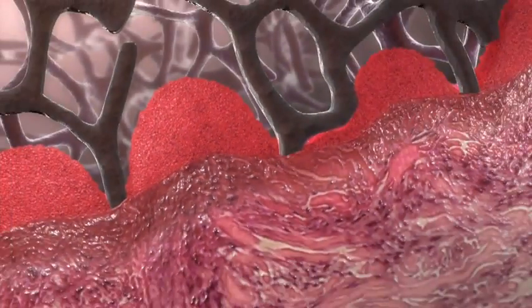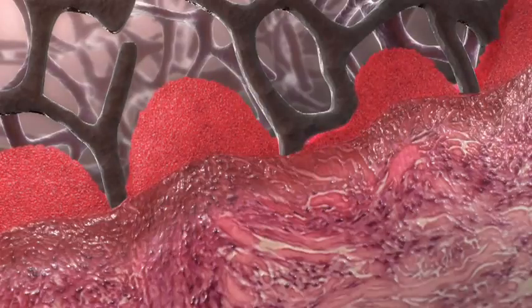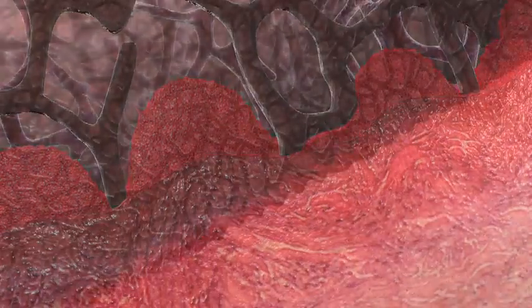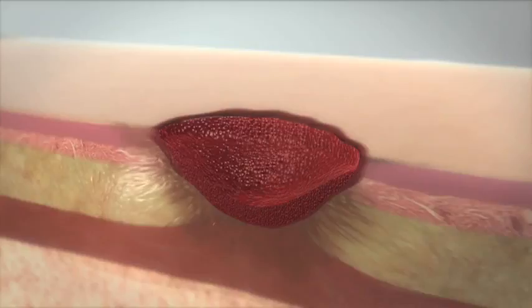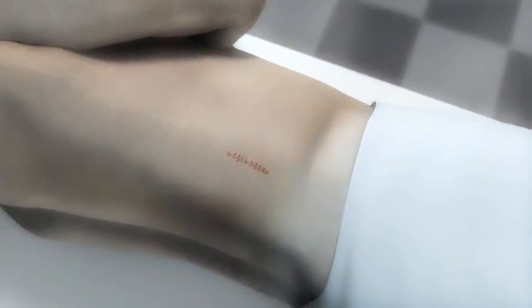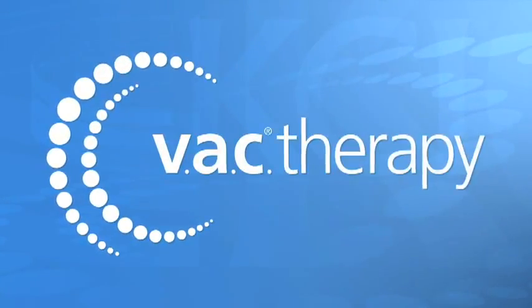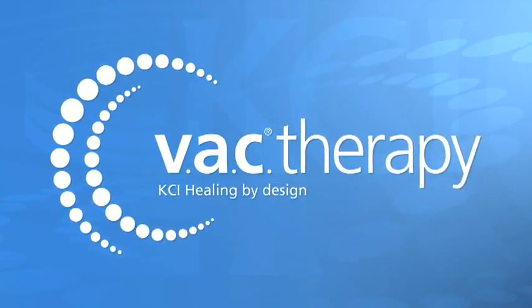All of this cellular activity leads to the formation of healthy granulation tissue in the wound bed and the characteristic undulations that have been seen in wounds treated with VAC therapy. Over subsequent dressing changes, the granulation tissue fills the wound bed, further reducing the volume and preparing it for final closure by secondary or delayed primary intention. KCI's VAC therapy system, healing by design.